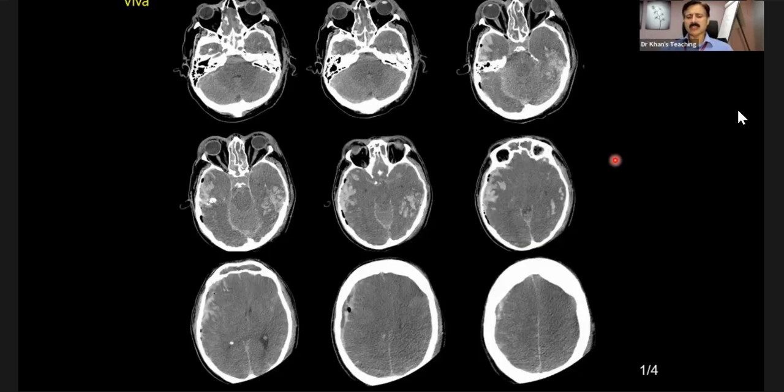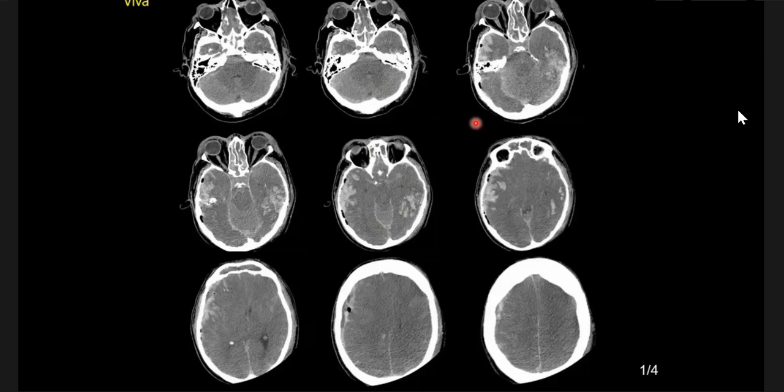So what will happen, and this has happened in the trauma world, it has happened in some other worlds also. The examiner has asked you to tackle this case, and this is diffuse brain swelling, a lot of edema. There is loss of gray white matter differentiation. In this case, it is post trauma. And then you can see a white cerebellum sign. If you see the cerebellum, it is normal in density. So the bottom line is that there is anterior circulation ischemia. And please remember that it is because of trauma. Now, here the Viva question is, why is there ischemia? This is the question for you. Because of the increased mass effect and the hemorrhage around the middle cranial fossa, I think it has compressed the anterior circulation arteries, ACAs, and that's why the anterior circulation has completely become ischemic.